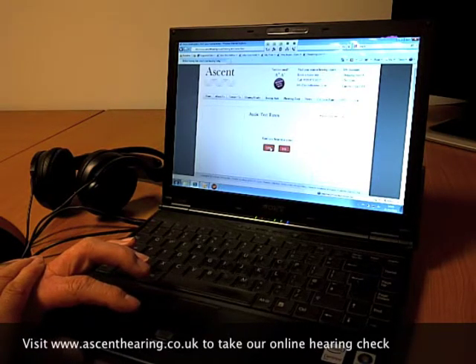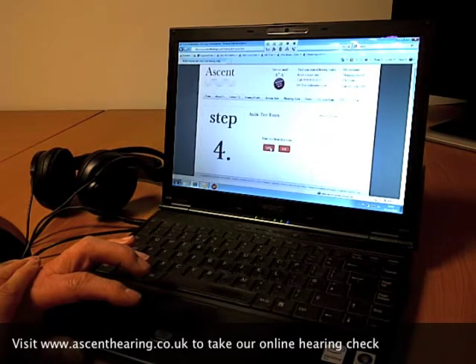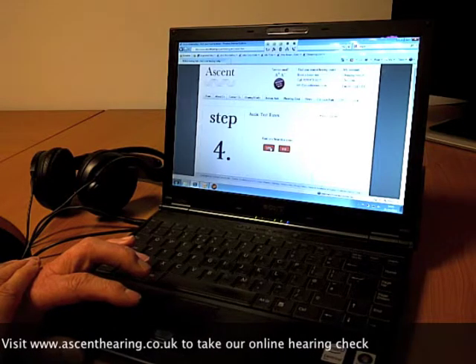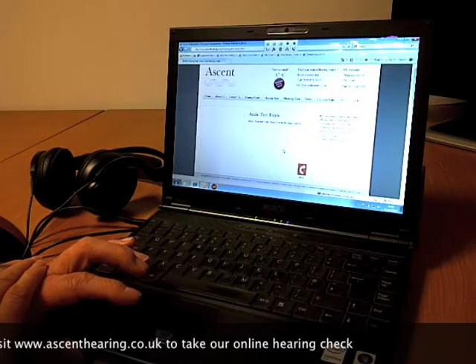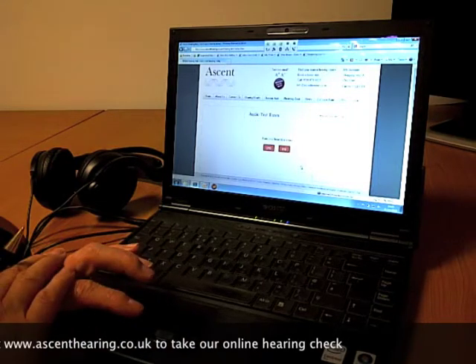And finally, I'm going to be presented with, my understanding is, a very high pitched signal, a very squeaky signal. I'm listening, but I'm not hearing it. So in that case, I'm going to click no, I didn't hear it. So that's completed one ear. I'm going to move on now to test my other ear.